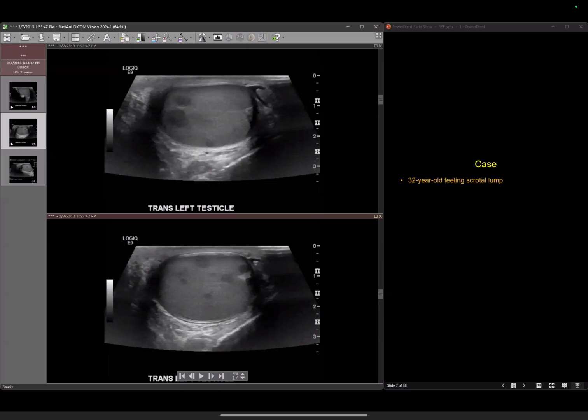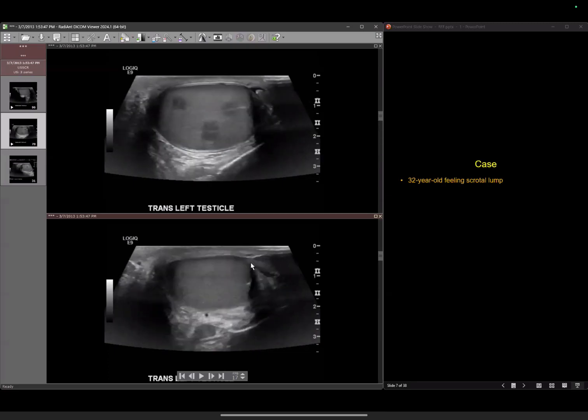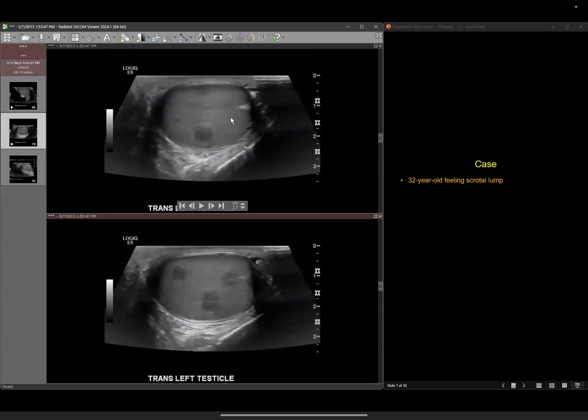What are the differential diagnoses? Most likely, sir, it could be metastases, and given the age, it could be lymphoma or any microabscesses, infective or tubercular etiology. First of all, how common are testicular microabscesses? Do you see a lot in your practice? No, sir. Yeah. So I think you said lymphoma and metastases; those are appropriate.